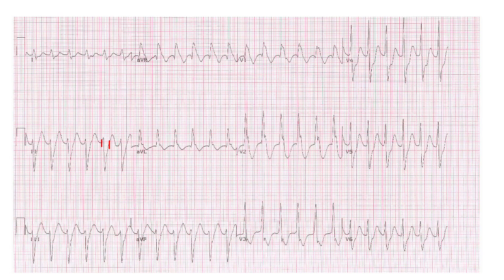All right. And then next would be my atrial analysis. Can I find any discrete P waves? And I'm going to look in every single lead. And remember, my 10 seconds in time runs all the way across here. Even though it's switching between leads, that's still running consecutively 10 seconds in time. As I look in each of these leads, trying to find a discrete P wave before my QRS complexes, I cannot find any clear P wave or atrial activity. So in this situation, I would then go to my ventricular analysis.